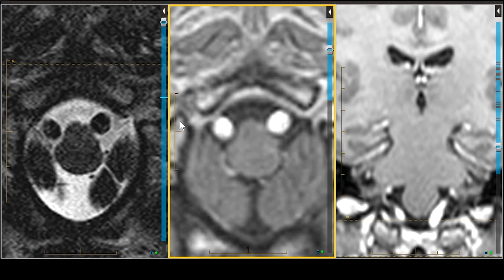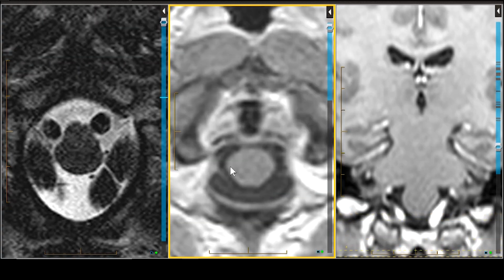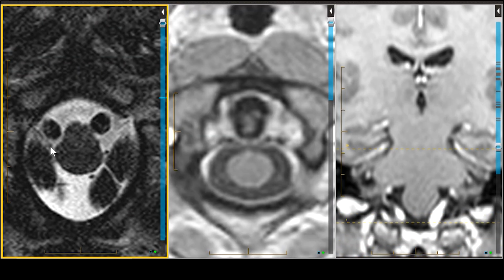But after emerging, it gives off a meningeal branch. It picks up a branch from the anterior ramus of C1, and you can start to see those branches as we scroll downward right here. Here are some of the branches down lower of the upper cervical region, C1, and then it travels close to the vagus nerve and spinal division of the accessory nerve, spiraling downward behind the vagus nerve and passes between the internal carotid artery and the internal jugular vein lying on the carotid sheath. So it's going to sit as you would expect, because 12 comes after 10 and 11. It's going to sit behind the vagus nerve as it descends.